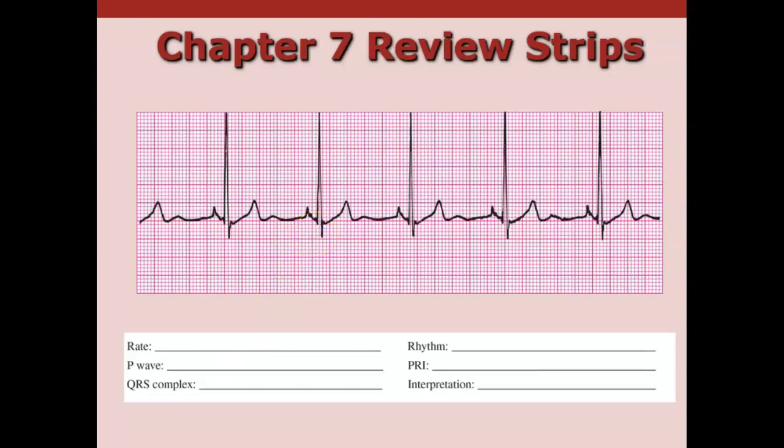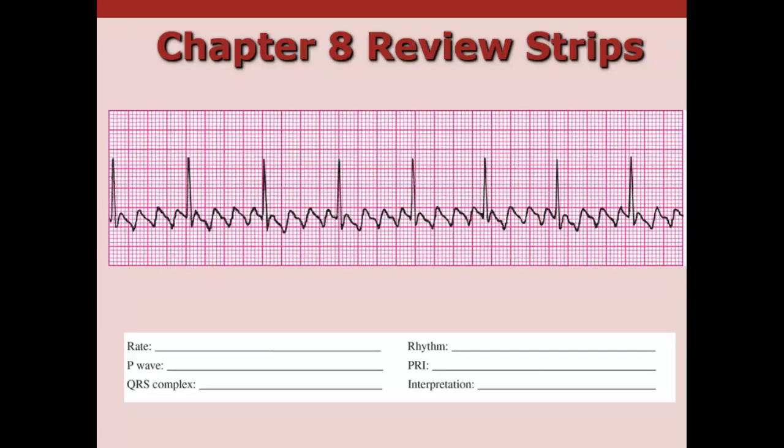Now let's move on. We're still in chapter 3. You see what it says. It says chapter 7. Remember, this is from old curriculum. So now let's move on and take a look at what else we have. Whoa, look at that thing. Let's take a quick little gander here. Let's look at our rate. 1, 2, 3, 4, 5, 6, 7, 8. A rate of 80.